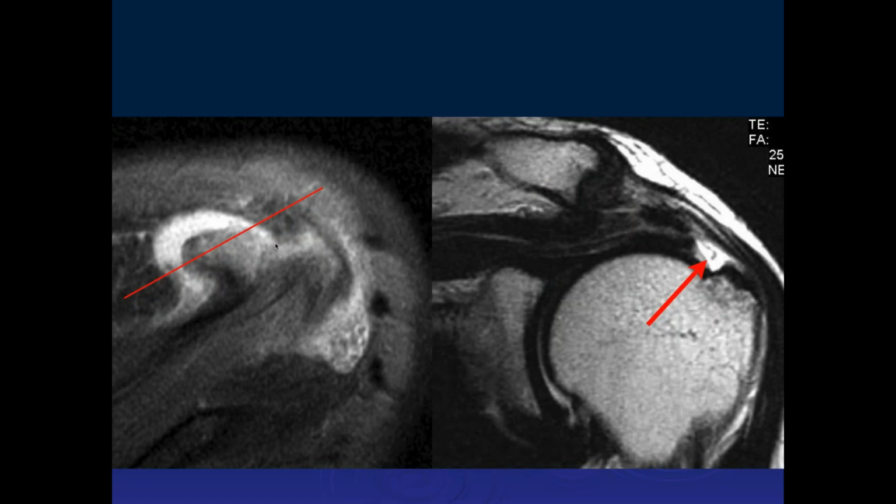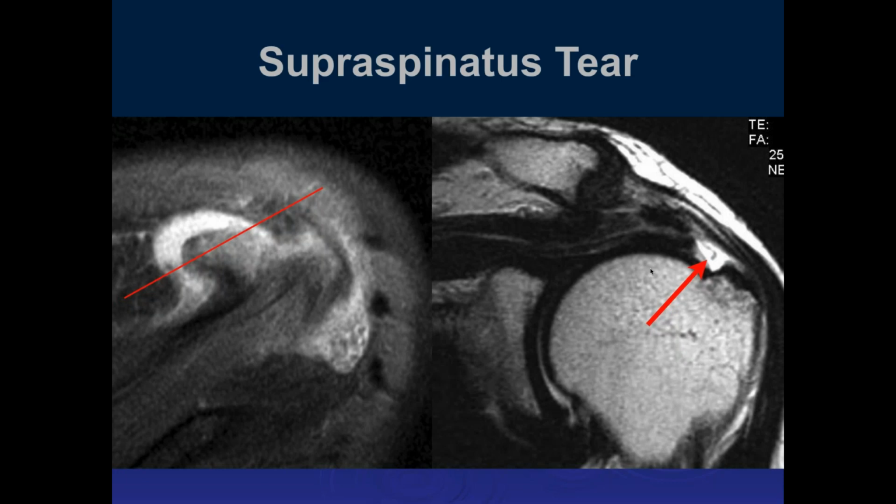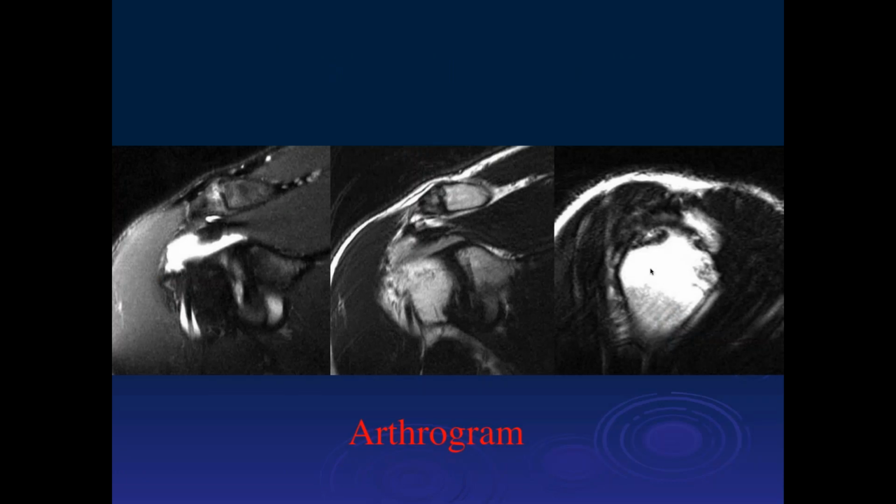Okay. What's happened is the anterior part of the tendon has kind of displaced anteriorly, and we were just seeing partial volume. Partial volume. So sometimes you can get some funny looking things due to the displacement of tears of the tendons. And here we can see some proximal retraction in the area of the tear, a little bit of retraction of the musculotendinous junction. So supraspinatus tear.